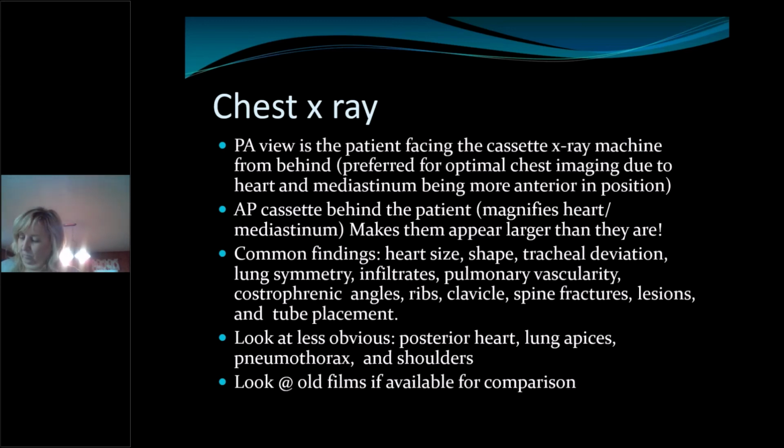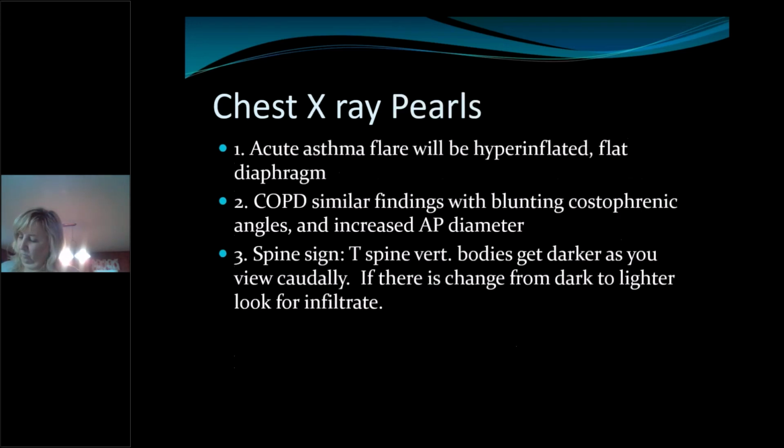A lot of people wonder, well, why the hell do we even get the lateral view? It's worthless. Well, you're looking at a chest x-ray straight on, you see that big heart. Well, what's behind the heart? How do you know what's behind the heart unless you get a lateral view? So a lateral view can help you look posteriorly behind the heart and see what's going on. It can also validate if something's real or if it's just an abnormality on the film. And when possible, look at old films. That's always helpful, without question, because especially in these folks that are COPDers, the folks that have a lot of scar tissue and things like that, old films can be really beneficial.